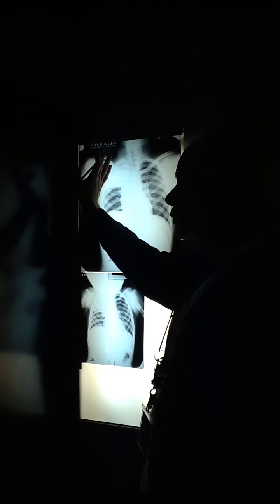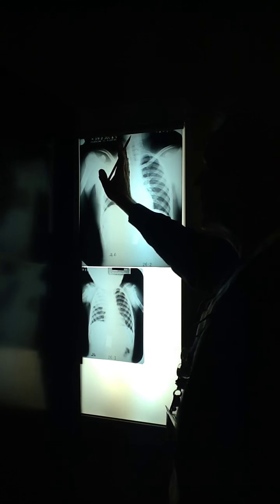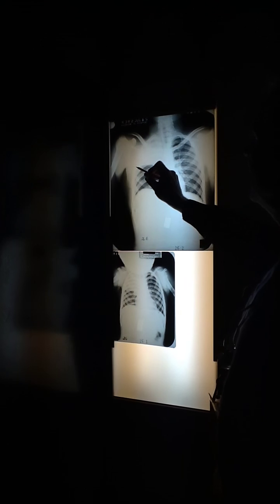This extends from the chest wall where it silhouettes to the mediastinum where it silhouettes, and in particular, where's the ascending aorta? Isn't there supposed to be a heart border and an ascending aorta? Because isn't there supposed to be 2 bumps on the right side, 2 convex borders on the right side? Where's the convex border on the right side that's supposed to be medial to the hilus right in here? Can you see it? No. Why not? Silhouette sign. So it goes from the chest wall to the mediastinum, silhouettes the ascending aorta, and from the apex, terminating at a horizontal, well-defined line in the mid-right lung field at the level of the right lung hilus.